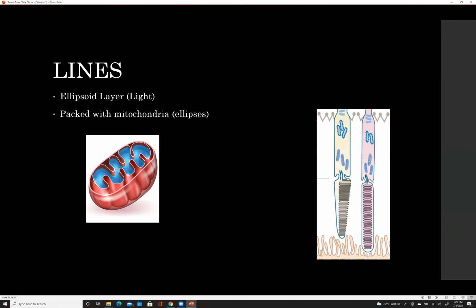And if you can imagine this part, and we're going to show right here, that's where the mitochondria are. But this entire thing, just letting you know, is the inner segment. This is the inner segment of the photoreceptor. If you want to consider the ELM part of it, the inner segment really has this myoid zone with these intracellular organelles that are very, very loosely packed.